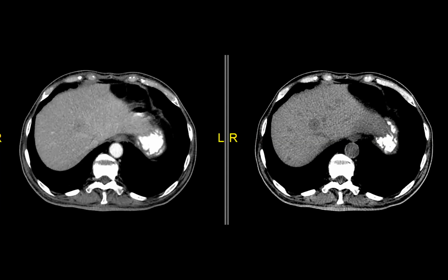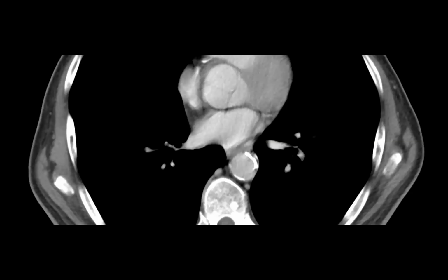Nice. It's almost like an MR. Do you have the coronal? I do. The Roscoe Miller Award from SAR last year looked at what patterns of behavior differentiate us being able to detect metastasis versus not.